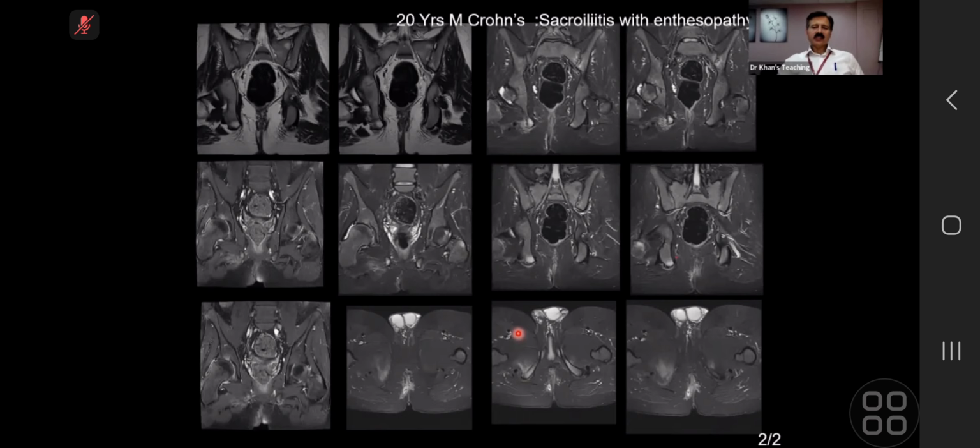The point is that this is classical acute enthesopathy. What is happening is that in this patient you see there is bone marrow edema, there is also soft tissue edema, and which can happen. So this is why I'm showing it to you. If you look carefully, there is actually a perianal fistula. Perianal fistula is a bit too tough for your FRCR exam. But having said that, you can see this enthesopathy. Look here, ischial tuberosity, and there was edema. And what I wanted to show you is that soft tissue edema is acute enthesopathy. Okay, fine.